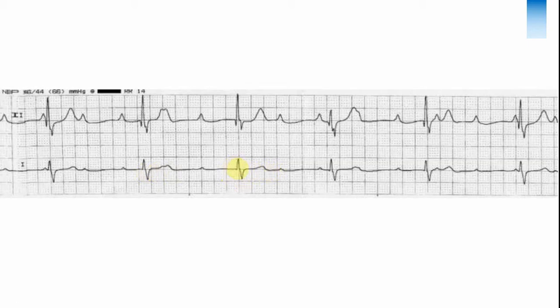Now, to compile all this information together, I am of the impression that the patient has a third-degree heart block. With the QRS complexes being narrow, it is highly likely that the block is at the level of the AV node or nearby. I am particularly concerned about this patient.